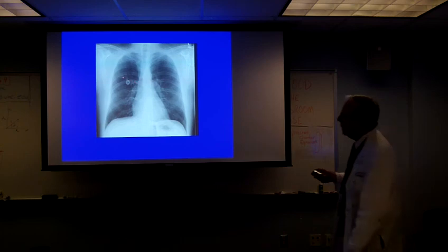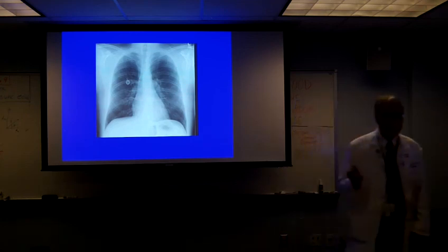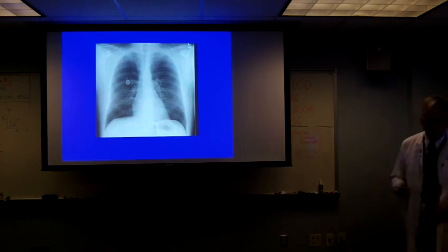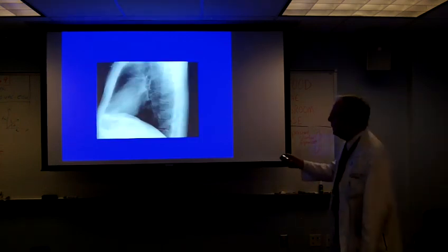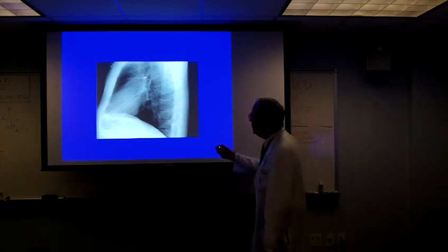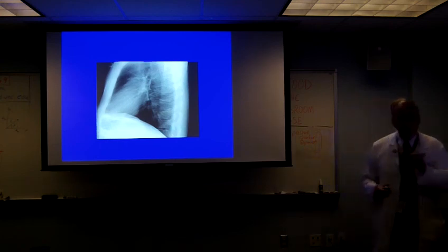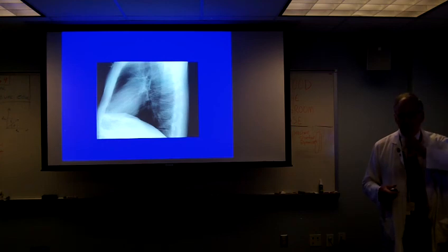This is a portacath that's been placed in the right subclavian vein, and it makes kind of a U-turn right here. You have to recognize that that is likely to be in the azygos vein. It doesn't look like there's a whole lot of catheter there until you do this, and you see that actually that catheter extends quite a ways back in the azygos vein, which is an arched structure. So if you see a catheter that is coiled on itself right in the region where the azygos vein is, which is right over the top of the right main stem bronchus, it's in the azygos vein.